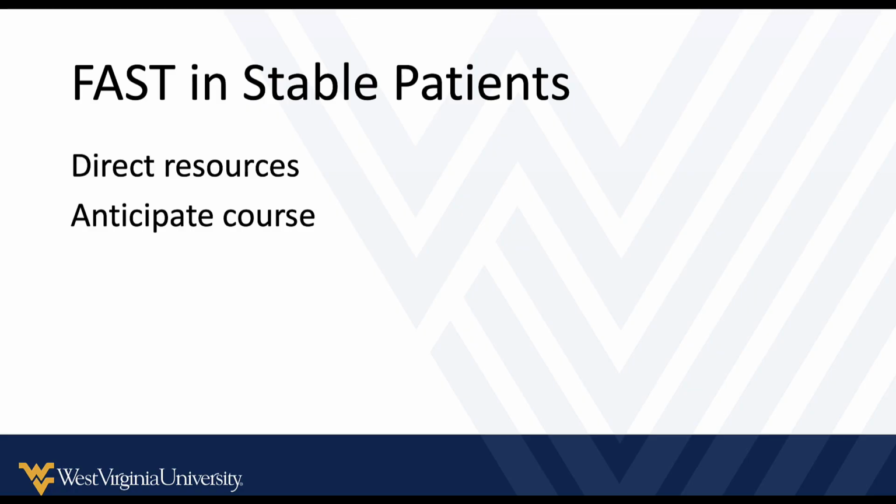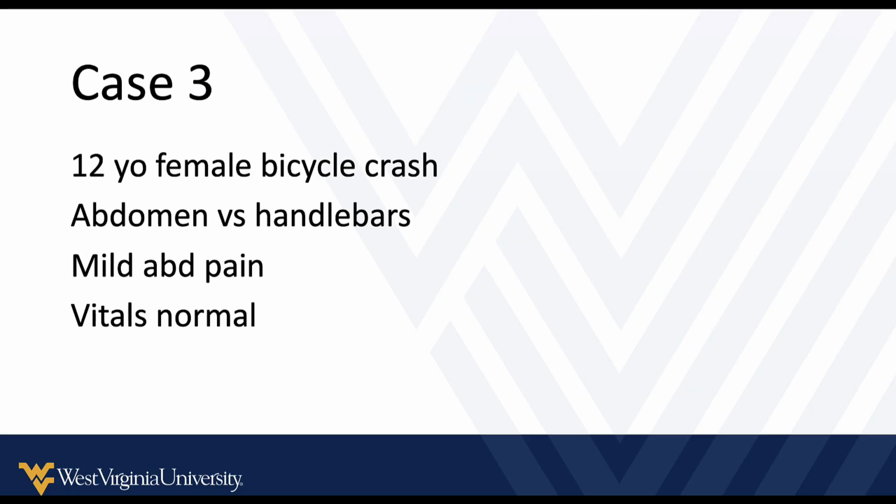And that's how the additional information, when you combine point-of-care ultrasound with your history and physical, can be powerful information to help you manage patients, especially multiple patients, and sometimes make a difference that's going to save someone's life. All right, so we're going to get into our next case.